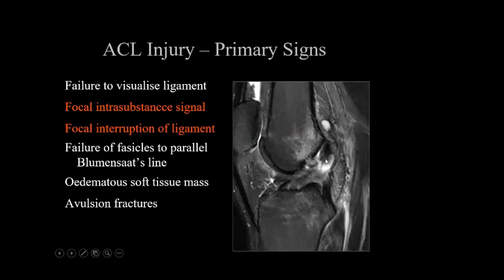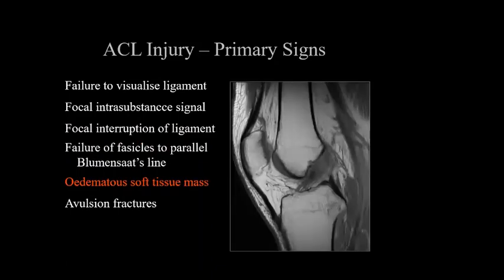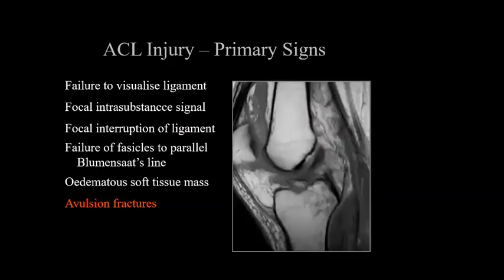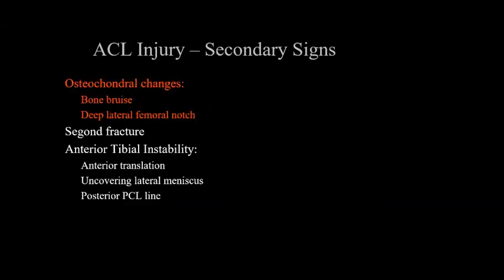So here, for example, more of a complete tear of the ACL. But when you see the sagging of the ACL, it is more characteristic of ACL sprain or partial tear. The other appearance of ACL tear is when there is complete thickening and edema, when the ACL is thickened, more striated. This is more typical for ACL sprain injury. And the example we looked at was the avulsion fracture of the tibial insertion of the ACL, when there's avulsion of the tibial spine, as we saw here.